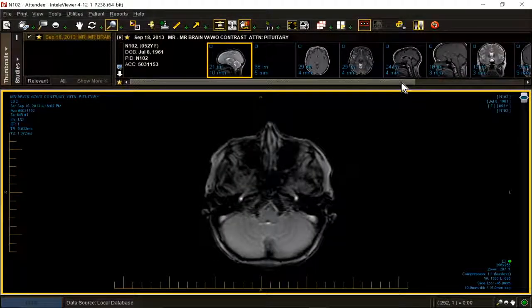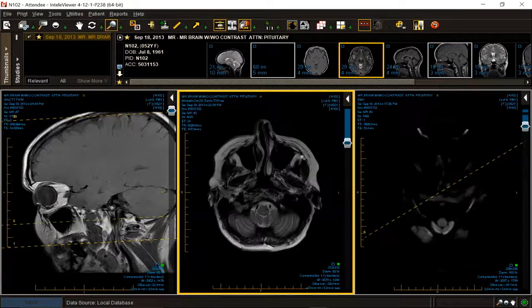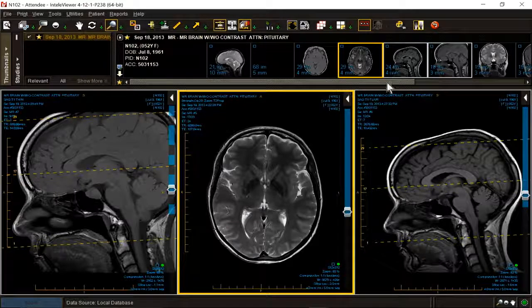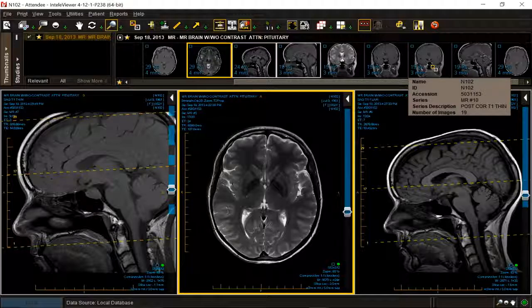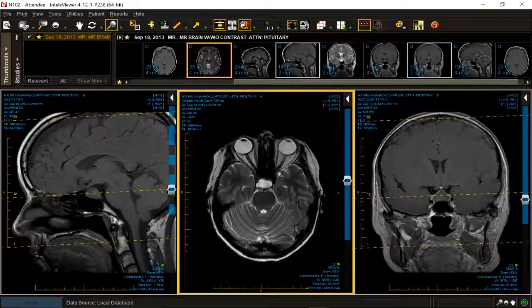A pituitary lesion. That's the history we're given. Okay, so while you're scrolling, some tip-offs to your approach for the sella, which will be on MRI Online.